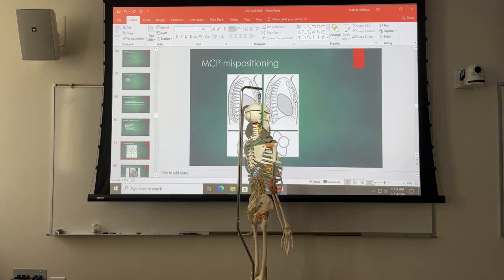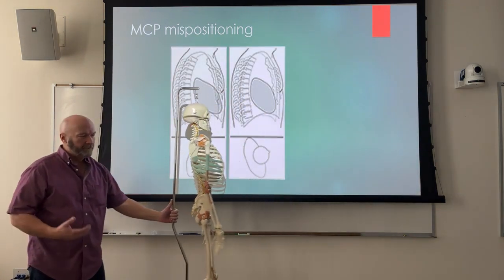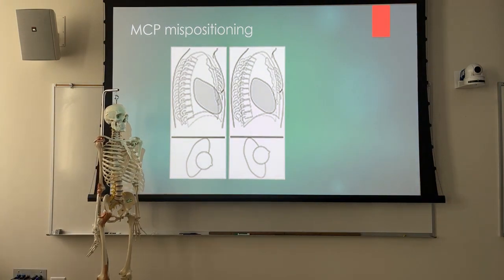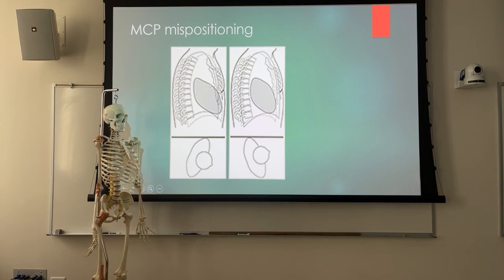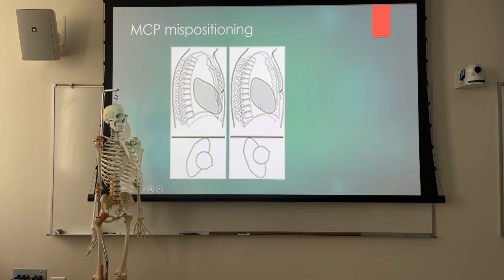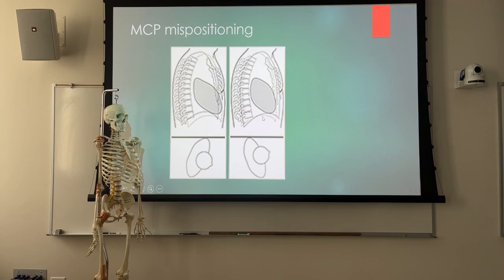Okay, so some of the images from the textbook don't translate very well. I can save them in a couple of different ways, and sometimes they come out little bitty, and by the time I magnify them up, this is what you get. So that's what it's talking about, and the description of the image in the textbook shows the shadow of the heart, how it can project anterior to the sternum, which is legitimate, but my eyes, I just don't see it very well, to be honest with you. So gastric bubble is a whole lot easier for me to detect. So in this case, gastric bubble would be here. In this case, gastric bubble would be further back, if you see it at all.